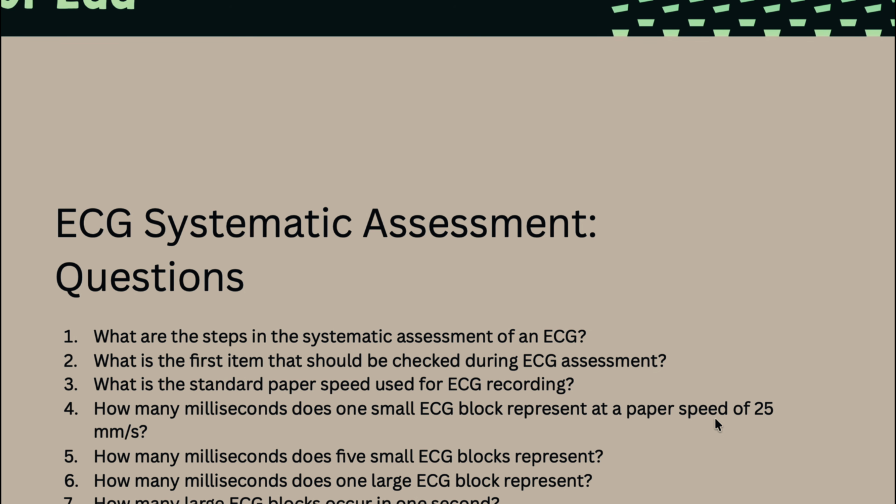The key to ECG interpretation is having a consistent approach. So every ECG should be assessed in the following order. First, patient identification, then standardization, rate and rhythm, P-wave morphology, PR interval, QRS complex, including its width, height, axis, and Q waves, followed by assessment of the ST segment, T wave, and finally the QT interval. Using the same sequence every time helps prevent important abnormalities from being overlooked.